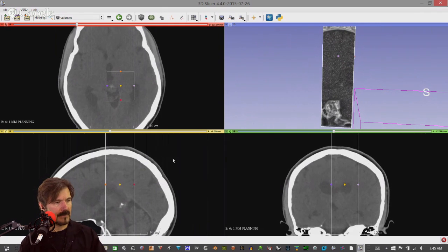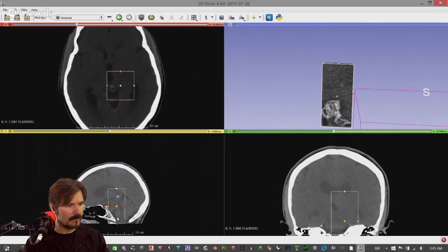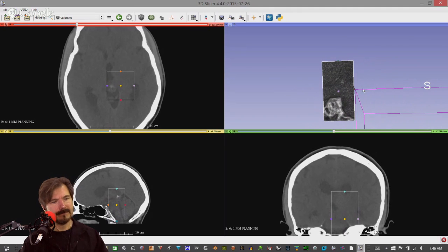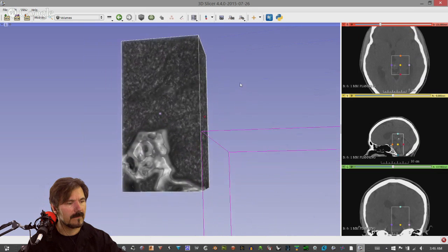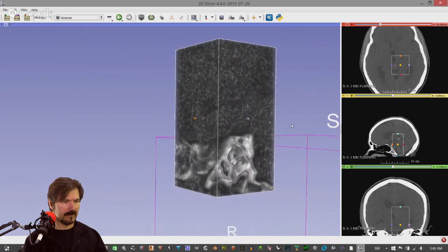Yeah, you can actually see it kind of nicely on the 3D right there. And then let me bring this down. Okay. If you come down a little bit, you actually had it visualized. See that opacity? See it right there in that plane. Okay, so let me change my screen again. Let's go to the wide screen. Let's zoom in on it. So you think that's it? Yeah, I think that's what it's showing right there.